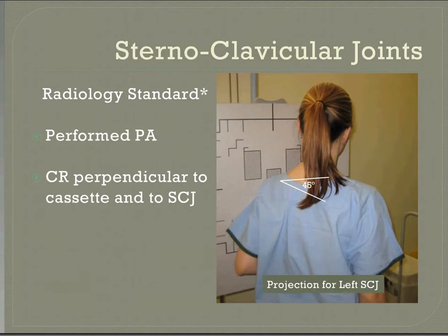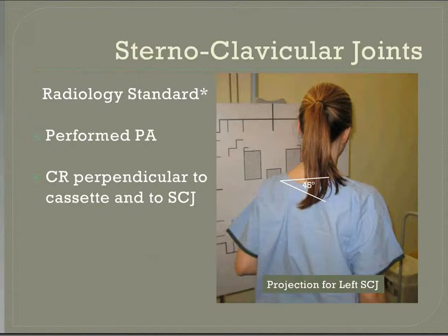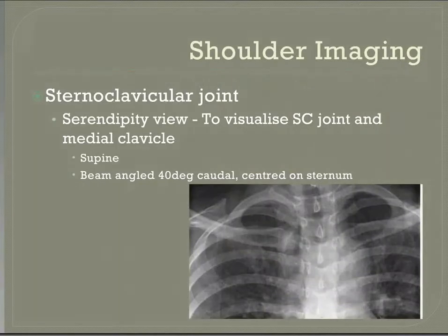this picture, which is difficult to see on there, but if I show you the previous one that we had with the Zanca view, it gives us quite a different image. Oh, sorry, serendipity view.